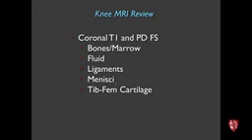One needs to be aware that you can see meniscal tears on just one plane. There's some tendency to look only at the sagittal plane for the menisci, but it's better to realize that you can see a tear on just one plane. Coronal is quite good, sagittal is also very good, and axial can be helpful as well. Then I go through the tibiofemoral cartilage and look at the medial and lateral compartments.